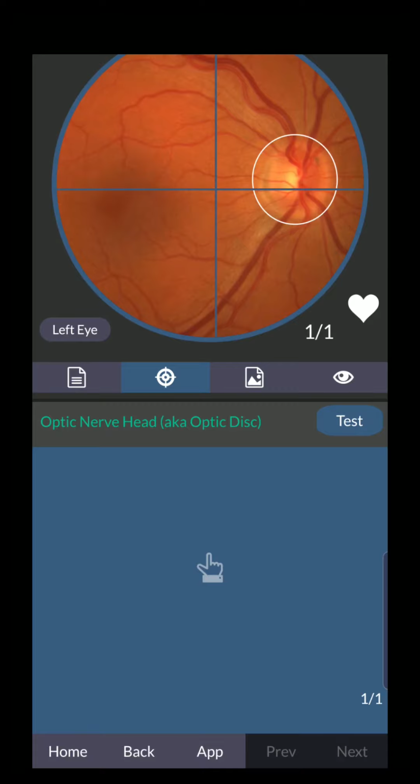You'll also notice on the target touchpad there is a fraction, in this case 1 out of 1. That means that there was 1 annotation in this particular set, and you hit 1 of them. So you got all the annotations correct for that particular optic nerve head. There's only 1 optic nerve head, obviously.